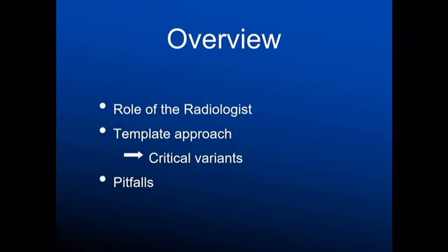What I'd like to talk about is basically the role of the radiologist when reporting sinus CTs, and run through a general template approach that you can use, highlighting the critical variants that are important to mention when we're reporting sinus CTs. I will show a couple of cases of inflammatory sinus disease, but mostly I want to highlight some of the pitfalls that you should be looking at, which should raise concern for an alternate pathology.